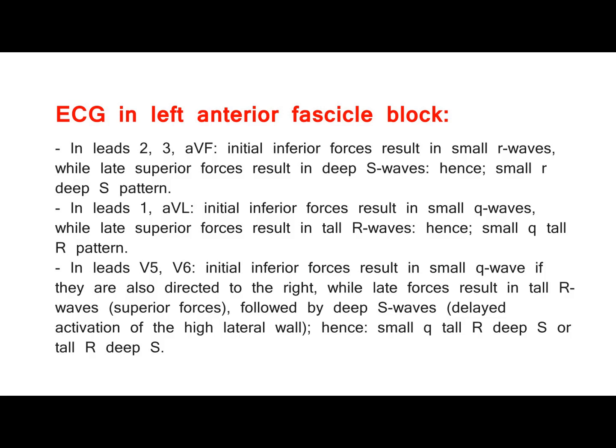In leads 2, 3, aVF, initial inferior forces result in small r waves, while late superior forces result in deep S waves, hence, small r deep S pattern. In leads 1, aVL, initial inferior forces result in small Q waves, while late superior forces result in tall R waves, hence, small Q tall R pattern.